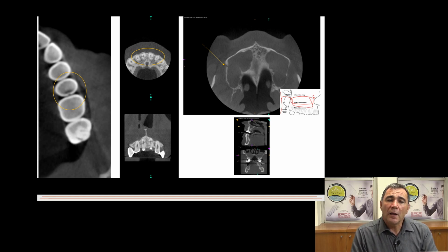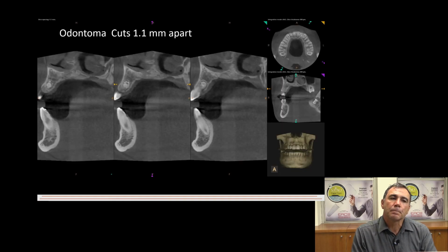And in this case you can see the posterior superior alveolar artery, and anybody that does implant surgery and does sinus lifts, lateral sinus wall lifts, has come across this artery, which can be quite an annoying bleed. But if you know where it is, you can plan around it or make alternative plans.